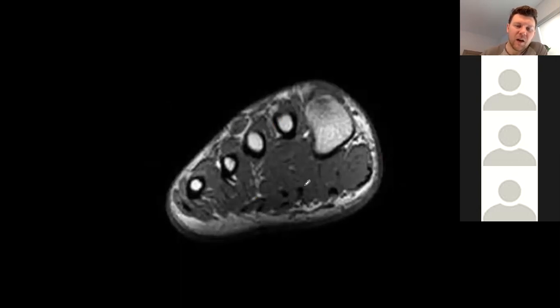So when we talk about tendons, if we see a small tendon that's more superficial than a deep tendon, which one is that going to be? So think about your layers. Flexor digitorum brevis, right? Because it's in the very first layer, it's the most superficial muscle and then tendon. And then right here in the second layer would be your flexor digitorum longus tendon.